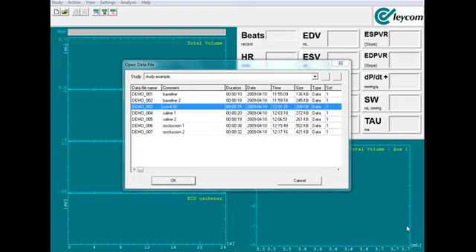Now we will actually walk through how to apply the volume calibration. In this particular example, we've recorded two baseline files, a third baseline file that we named a cardiac output of 4.02 liters per minute. This was determined by an average of 3 thermodilutions, and we have 2 hypertonic saline bolus injections. Note that by default, all recordings were saved as data files, and within dataset 1, which we will adjust for those files used in the volume calibration.